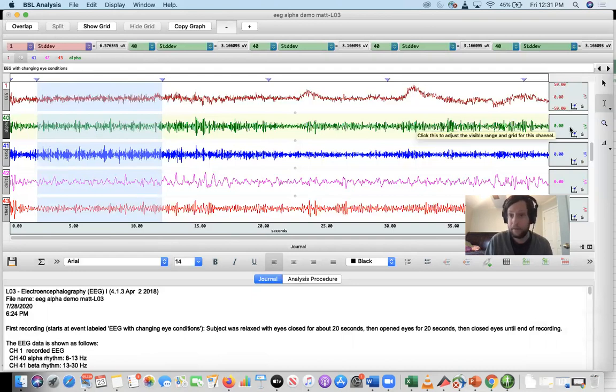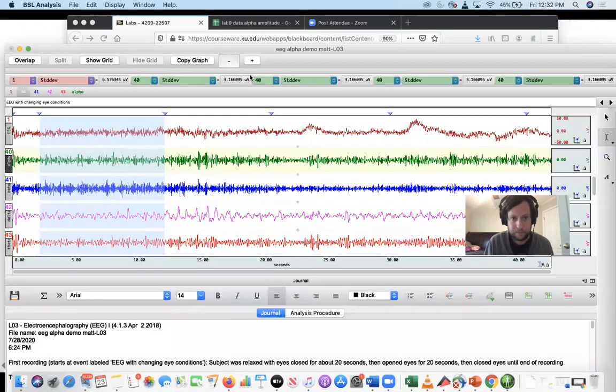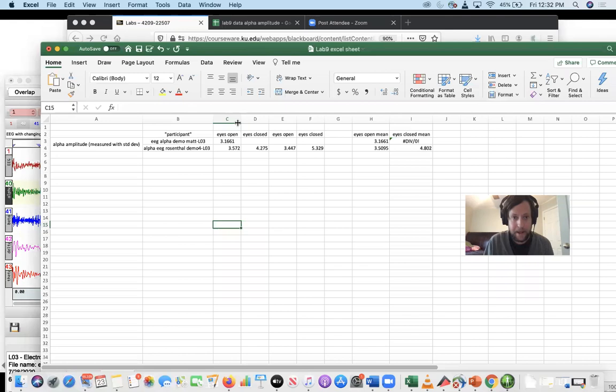So all of the alpha wave, and in particular, I need to see the portion that you have highlighted. It needs to be the first trial, which is an eyes open trial. And then I also need to be able to see the amplitude that was measured for the portion that you're highlighting in the alpha channel right there. And I'm going to be looking, does the number that appears right here in the screenshot match the number that appears right here in the Excel file for that group?